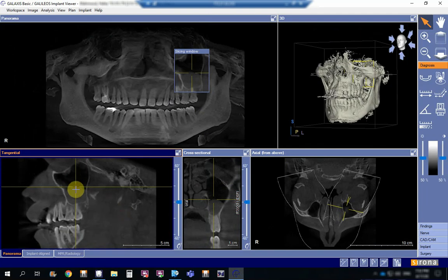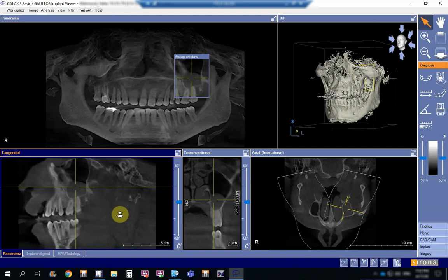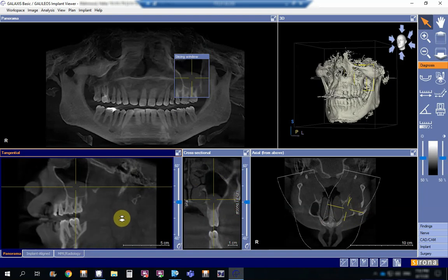Okay, I'll go now more outwards. See this thickening over here. See how it looks on the coronal surface, and in the axial view it almost appears to be completely blocking the sinus at this level, but actually it doesn't go to this complete blocking. See the dome-shaped radio-opacity of the sinus. It is more or less a thickening or a polyp. Anyway, I'll go more laterally.